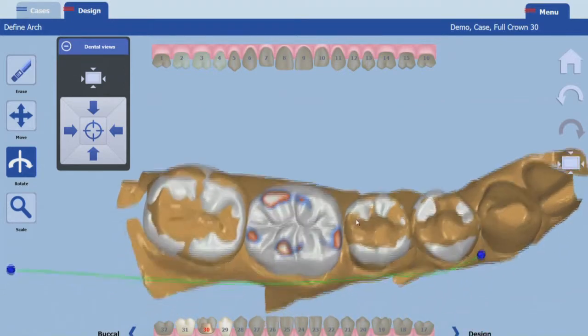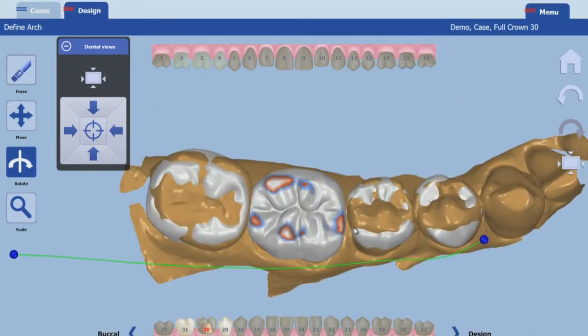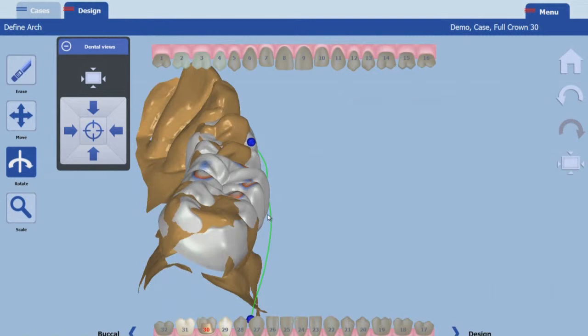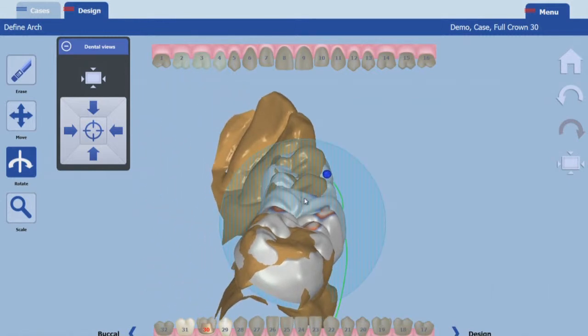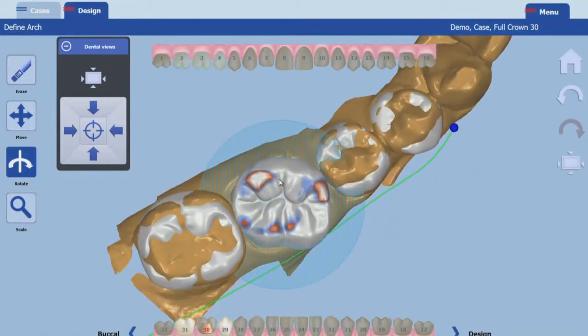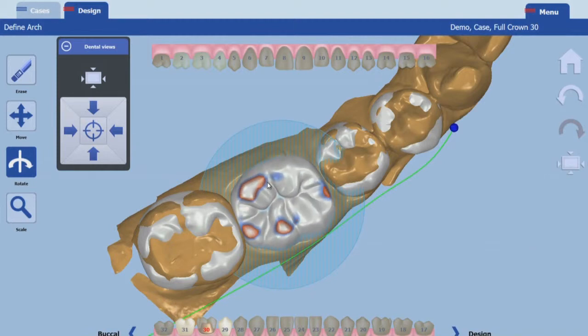The rotation is view dependent, so to rotate the proposal mesial to distal, view it from the lingual or buccal sides. To rotate the proposal buccal or lingual, view from the mesial or distal sides. To twist the proposal, view from the occlusal. Click and hold the proposal and drag side to side to rotate the crown.